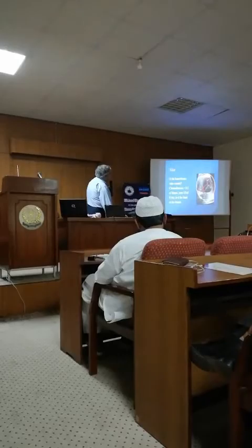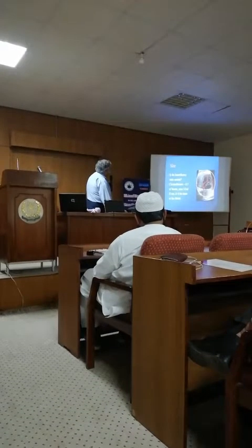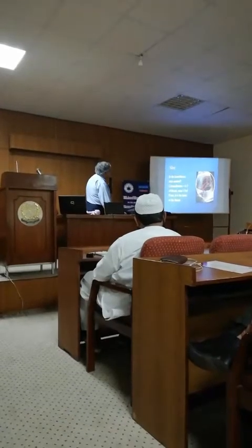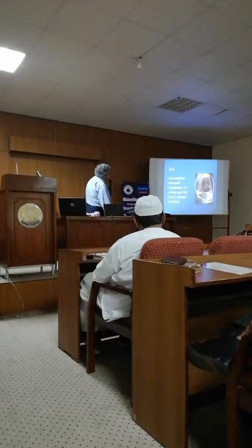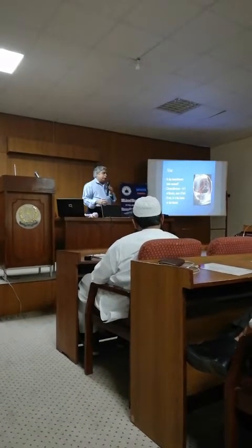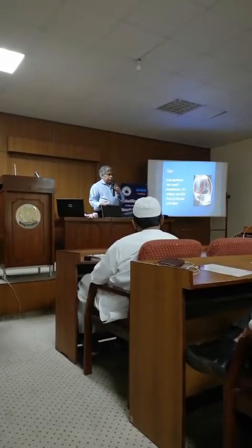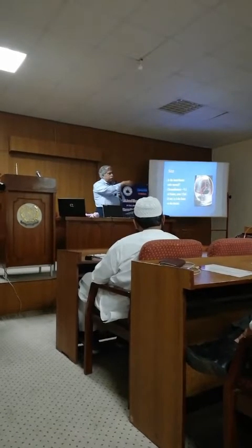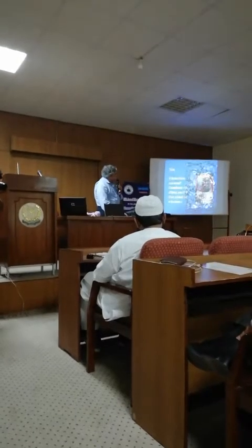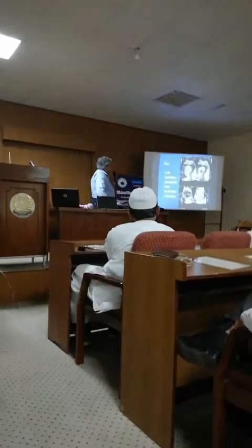Okay, so this is a heart. You have this area, and if you take out this, it probably fits in here, and you take out this, and it probably fits in here, and so you know that your heart is occupying about 1/3 of the chest area. But you really don't need to go through all of these drawing circumferences and all of those things.